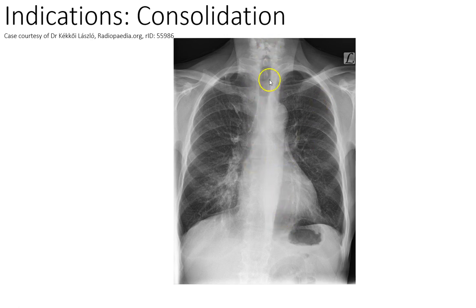So again, having a look at my strategic approach, what I can see is the spine is nice and straight and central. I can just about see the IVDs behind the heart. Maybe it is a little bit of a whiter film compared to the other one we've seen. I'm looking at the distance between the spinous process and the clavicular heads, and that looks fairly equidistant. So I'm not concerned that the patient's rotated. So anything, shift of structures that I might see, is due to pathology. It's not due to the patient's position.